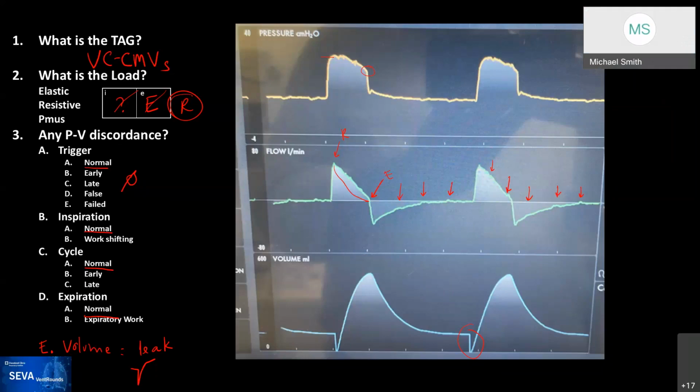That's a good question. Well, I guess the tidal volume here is set fairly high, just looking at the numbers down there, 550. Yeah. This is again venturing a guess.